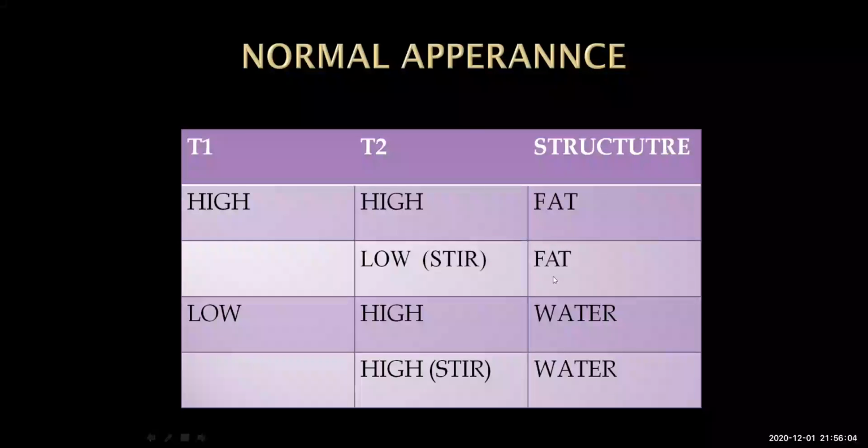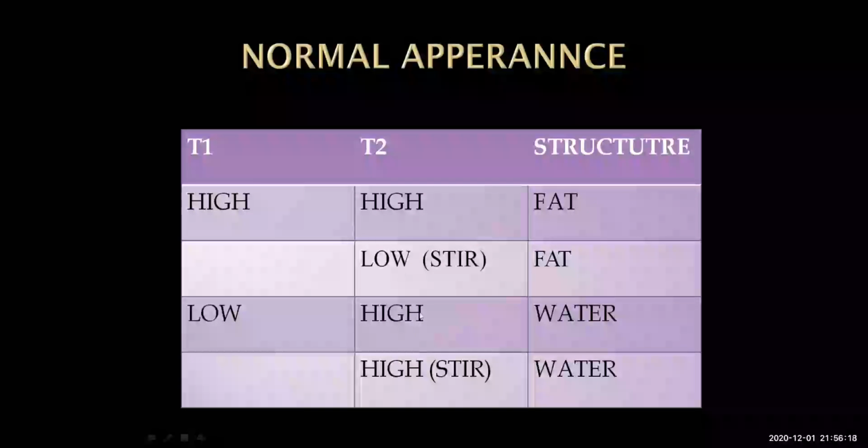Okay. Water, if I have a trauma, like intramedullary congestion, post traumatic, or I have an effusion inside the knee joint, usually appears in T2. We said T2 always shows us the pathology, and any pathology usually appears white.